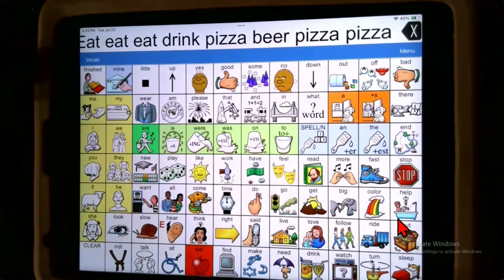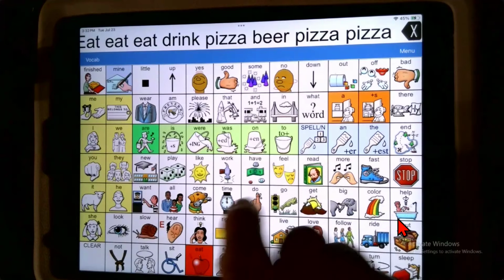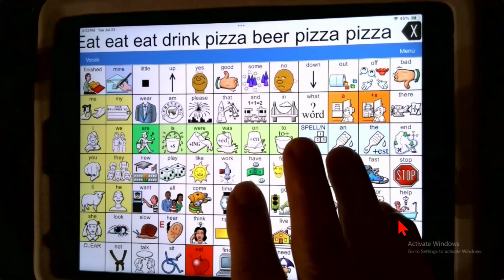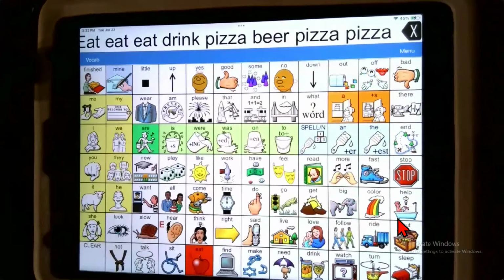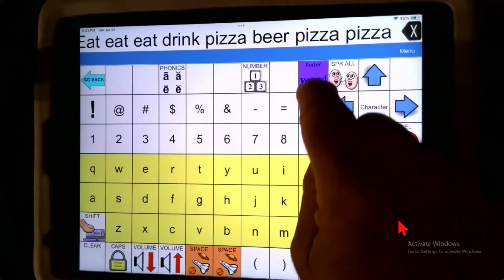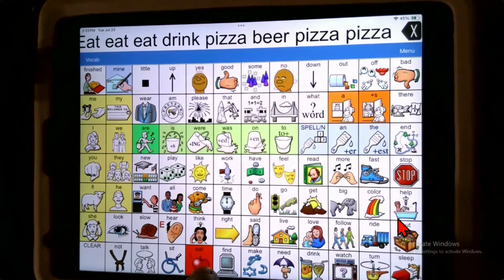Now, I actually find it easiest, if I had done this with 3 or 4 keys in therapy where I'd changed their colors, just to reset the home page like I taught you earlier to get them all back to white, but it wouldn't change them. You'd have to still go back and change these. Okay, so that's sort of a hierarchy from using spell mode, which is my favorite, to use word finder, to vocabulary builder, to color coding a key to make it stick out.